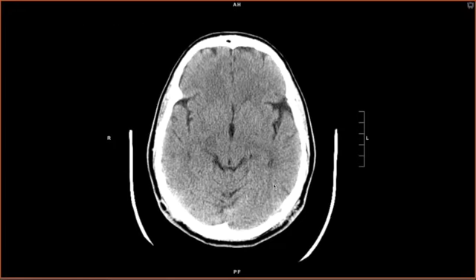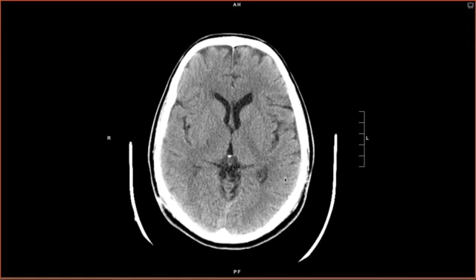Lastly, we talk about the vascular structures you can see on plain CT head. You often look here for signs of acute clot. We already said that acute clot is going to look bright because it is more dense than the other structures in the brain. So a very dense vessel might signify an acute thrombus. First, we discuss the arterial structures.